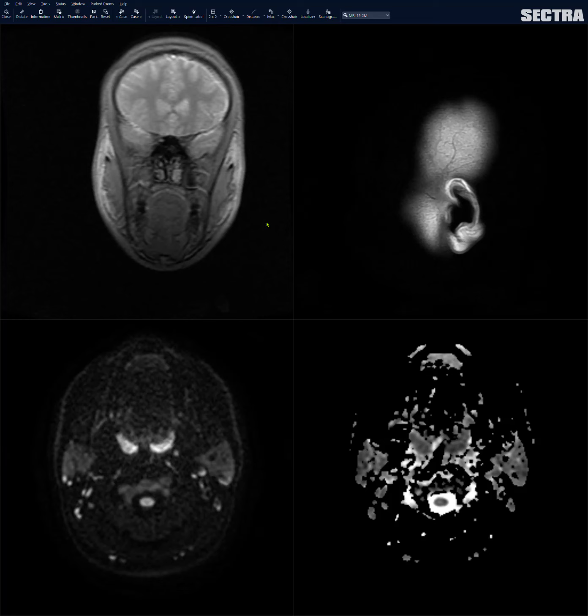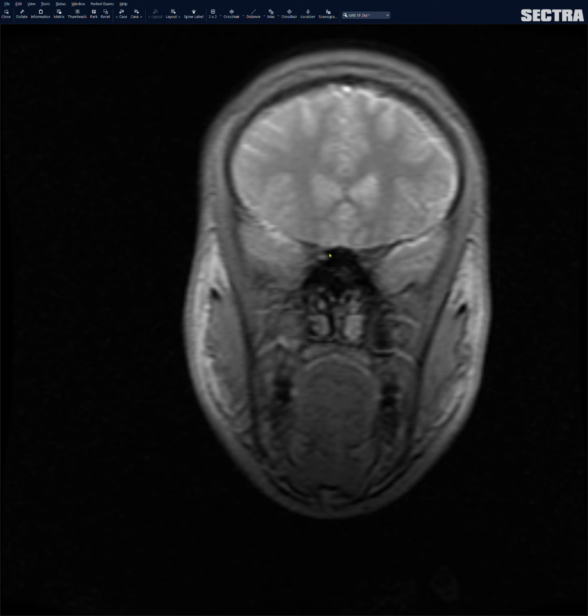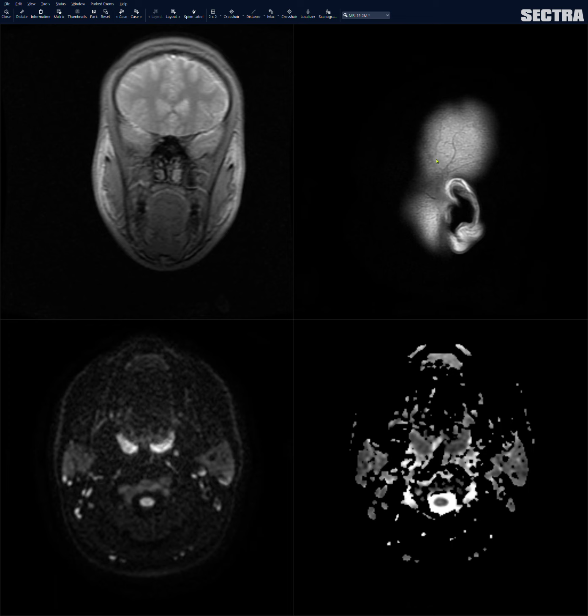In this video, I'll show you how I like to read an MRI of the brain with and without contrast. Remember, there's a bunch of different ways you can do this, so these are just some suggestions you may choose to incorporate in your practice. I'm pretty lazy and I like to just look at the sequences in the same order that the text gives them to me. This way I also don't miss any sequences that they might have sent through.